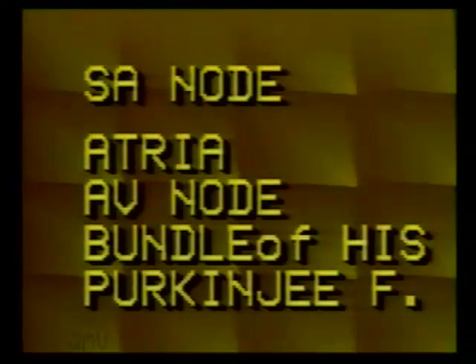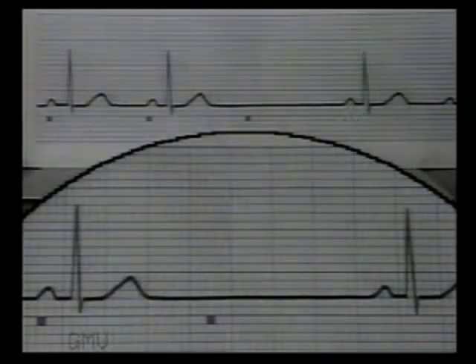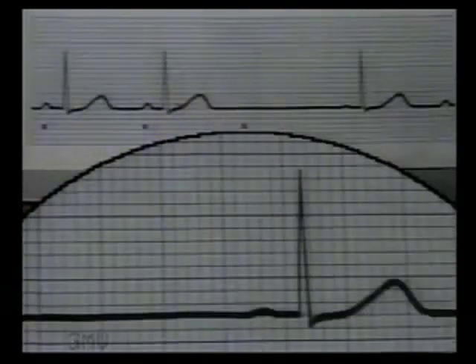But when sinus arrest occurs, the lower centers temporarily escape from the depolarizing impulses of the SA node, and one of them fires an impulse till SA node takes over again. So if this beat following the sinus arrest comes from one of the lower pacemakers, it is called an escape beat, indicating an escape from the inhibition of the SA node. A careful study of the beat after the sinus pause will tell you the origin of the escape beat.